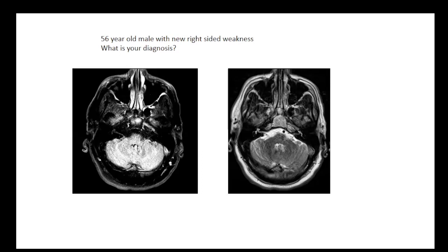Now you could be seeing it because of slow flow, and it can also be because it's thrombosed. And I guess the third choice would be it's dissected. But whatever it is, there's an abnormality here. Now, it's a little misleading because they're kind of crummy scans. You have a lot of phase artifact coming from the sinuses here.